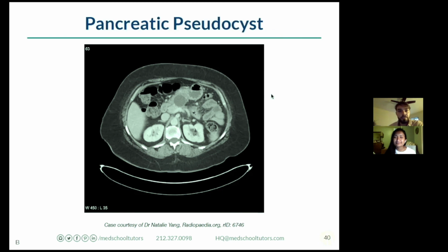I think, playing your odds here, this is going to be a pseudocyst, if nothing else. I'm not sure. I'm sure there's a radiologic finding that you can look at here as well, but pseudocyst is much more common than the pancreatic cyst.